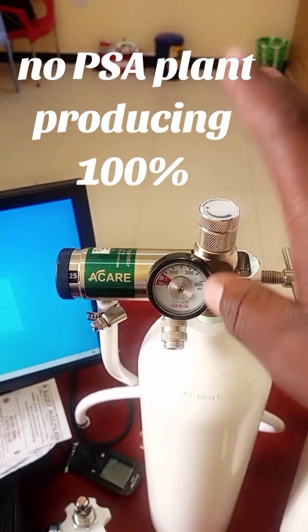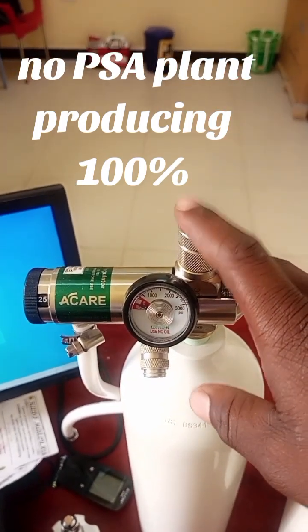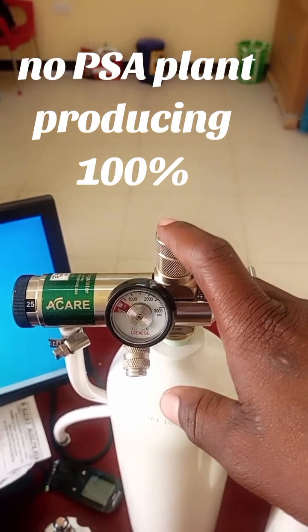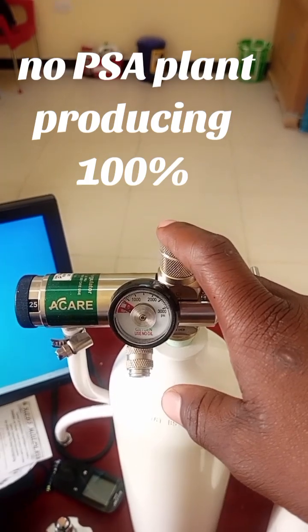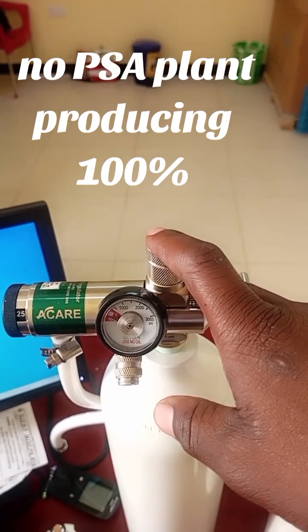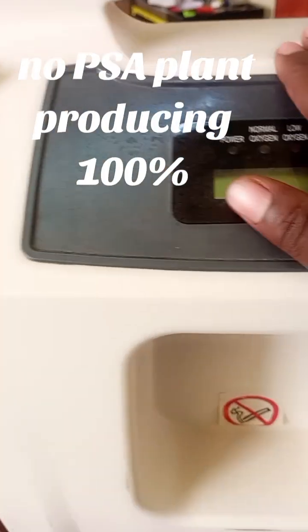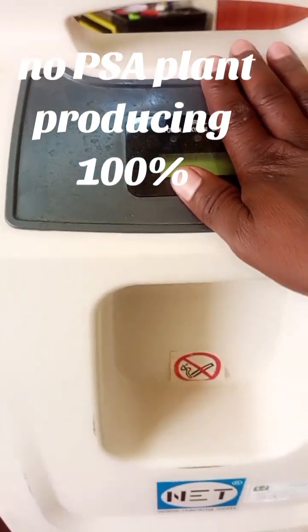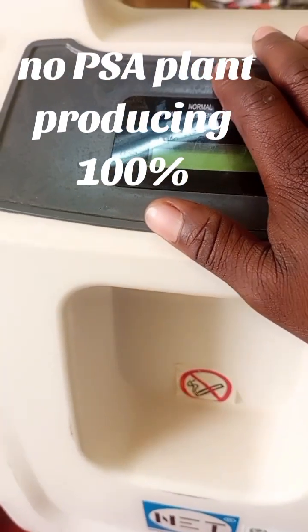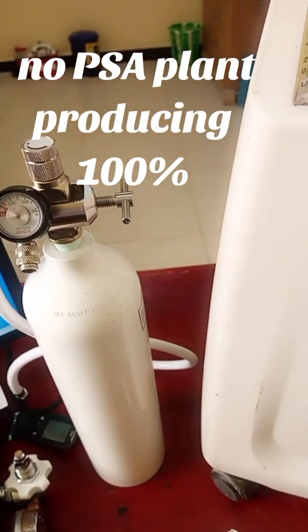But also the advantage of this one is that the purity produced from this gas cylinder is always ranging from 95% to 100%, though some literature also says 99%. But this, as I have said, produces 90% to 95%. So there is the difference between these two.